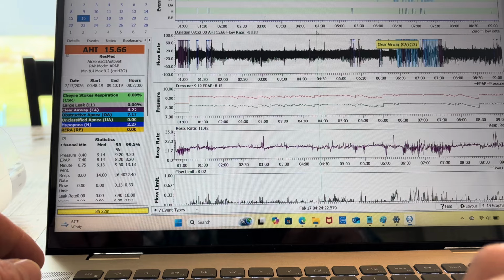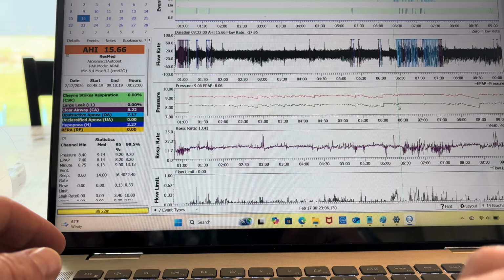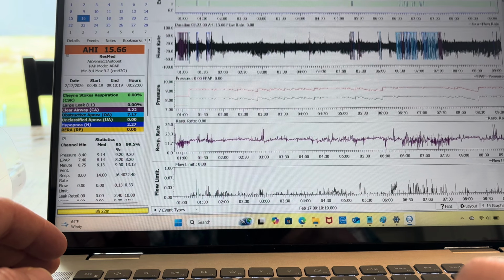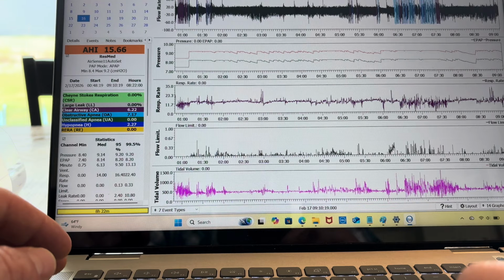That's where you can make adjustments. So now mine's up at 12, my max, to make sure I capture. You don't want to overshoot too much, so you have to play with it a little bit. If you raise it too much, it'll do what's called a spike, and then it'll do a CO2 wash, and you wake up with a headache or groggy. It doesn't do you much good to overshoot. So it's better to go in small increments until it doesn't max out, but it's close to the top of the scale.